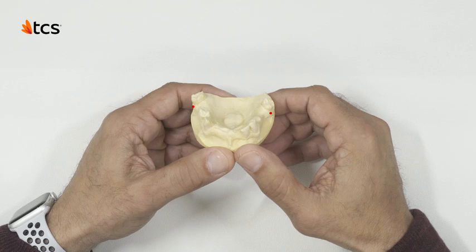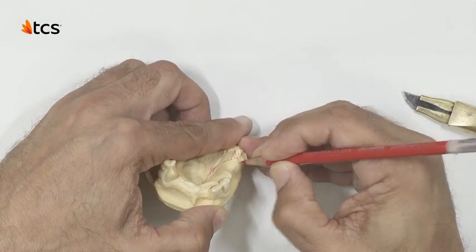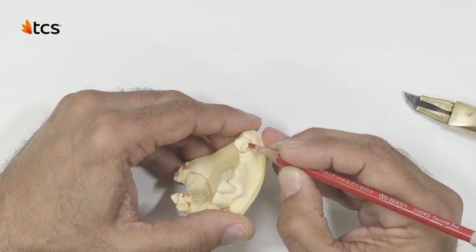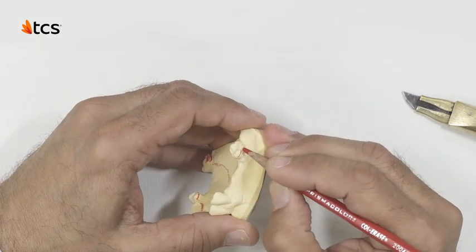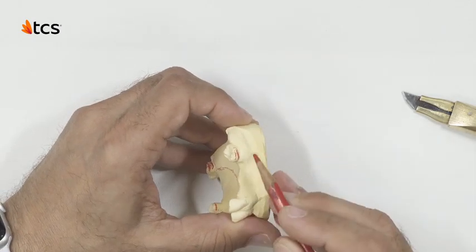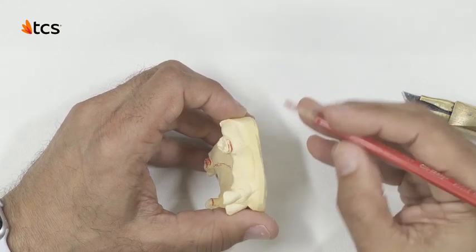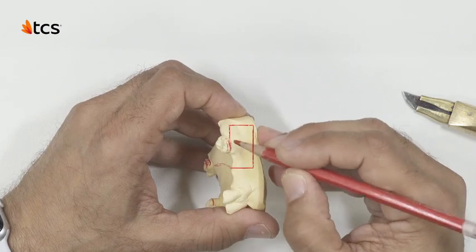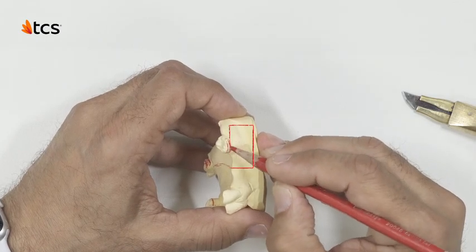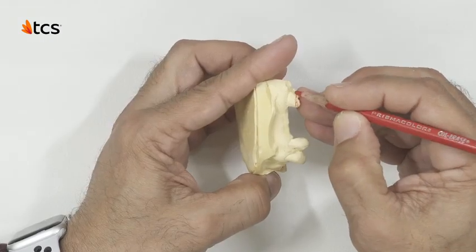As previously mentioned, the angulation of the molars create a challenge for the path of insertion. The opposing angulations of these teeth require an extensive blockout to get through this V shape. We can avoid an extensive blockout by creating a high finger clasp design in this molar. Doing so will avoid this sensitive tissue area that can cause discomfort to the patient during mastication.